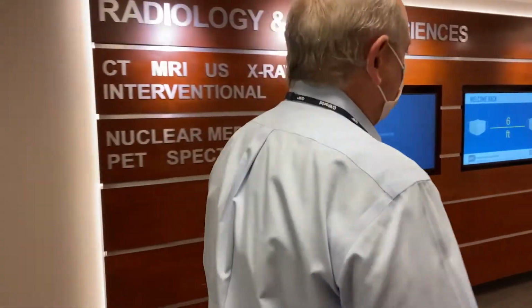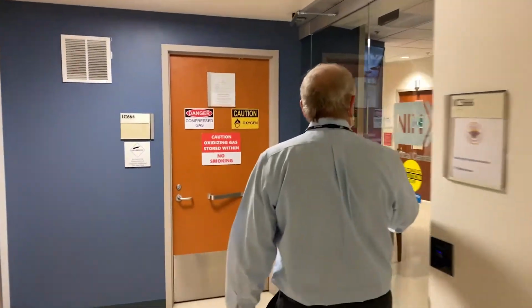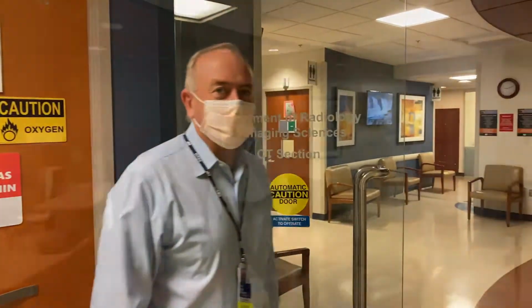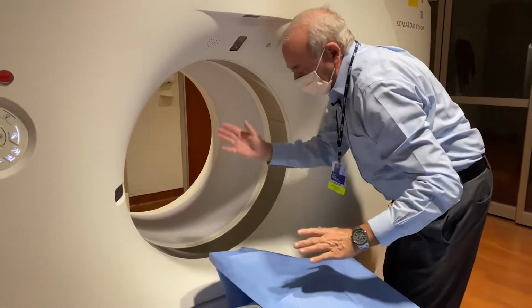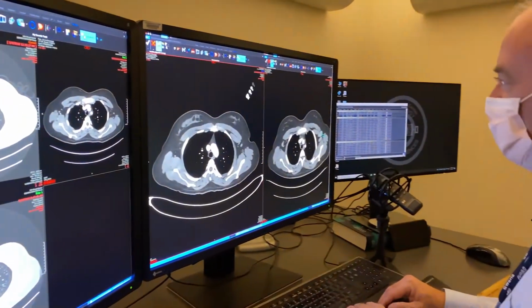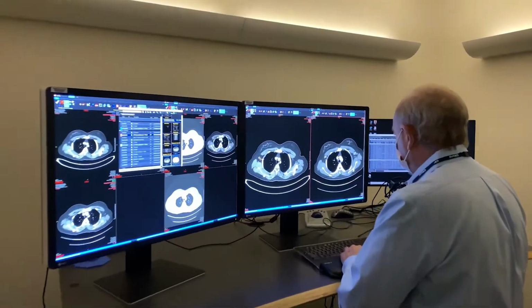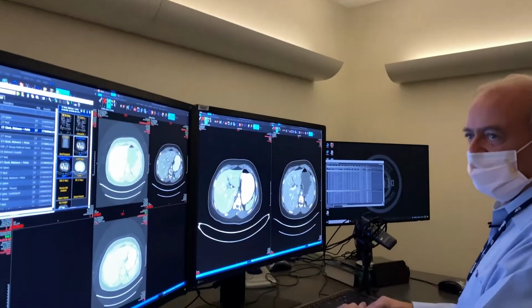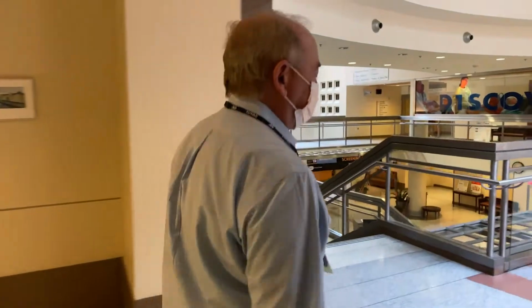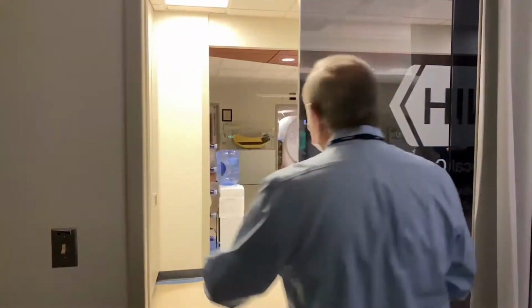Dr. Folio is a senior research physician and the lead computed tomography radiologist at NIH Clinical Center. He will provide an overview of our radiology preprocessing (RP) integrated workflow curriculum that includes image acquisition such as computed tomography or CT and PACS, otherwise known as Picture Archiving and Communication Systems. PACS is used to view medical images and includes highly advanced processing tools that produce multiplanar reformation, 3D imaging, and lesion management applications. And now we'll walk into the CT consult area.